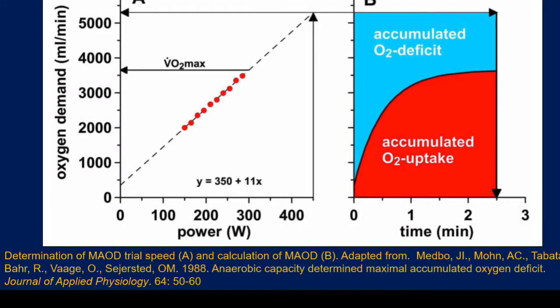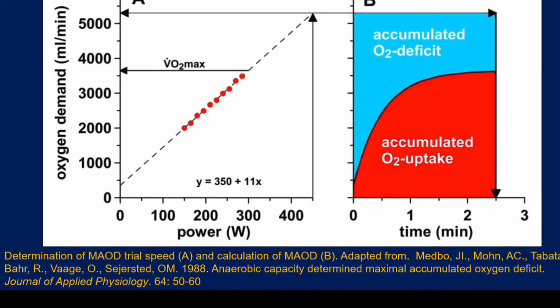Okay, so now we have the data. We've run the test. We've got the breath-by-breath data. The key thing that we have to do now is to be able to calculate the MAOD.